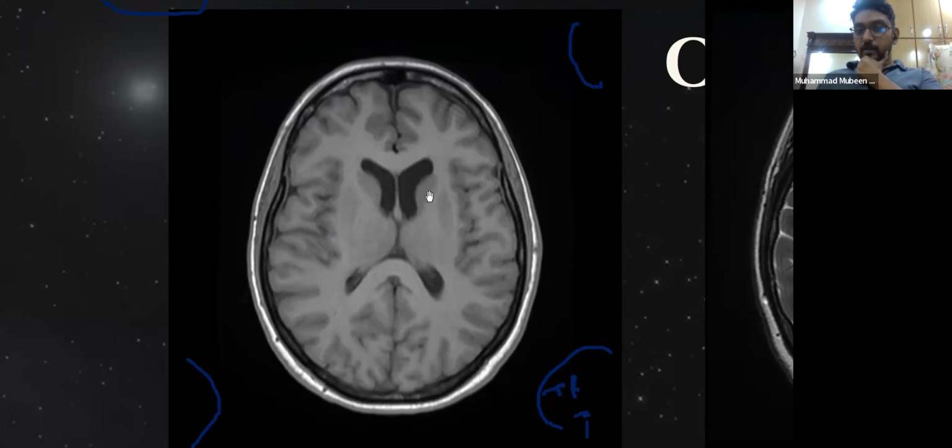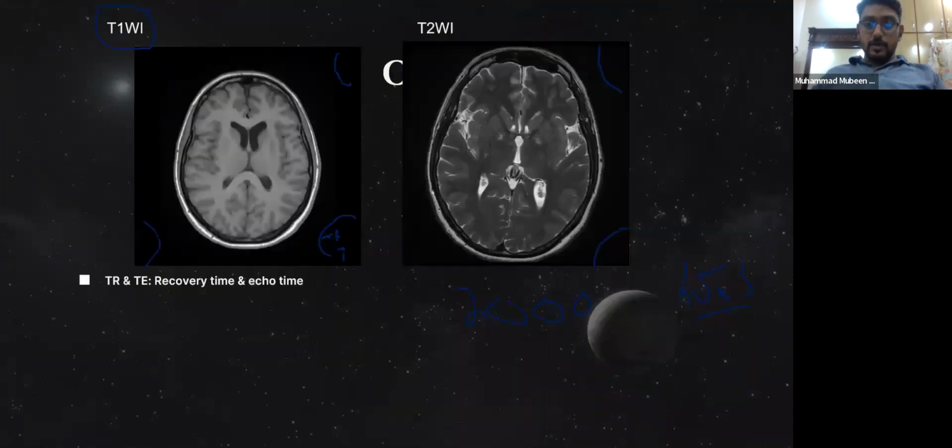You have the caudate nucleus with the gray matter lying deep within the white matter. It appears gray relative to the internal capsule, which again is appearing white. Again, you can see the external capsule, and the insular cortex is appearing gray. And the second most important thing, the CSF will always be dark on T1 weighted images. It holds true for all the body. The fluid will be dark on all parts of the body on T1 weighted images. It will be hypo or intermediate signal, but it will never be bright on T1 weighted images unless it has a very protein rich area.